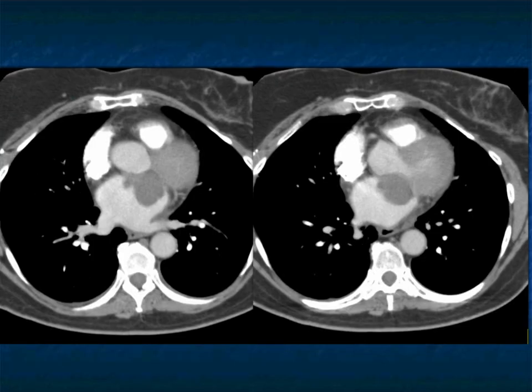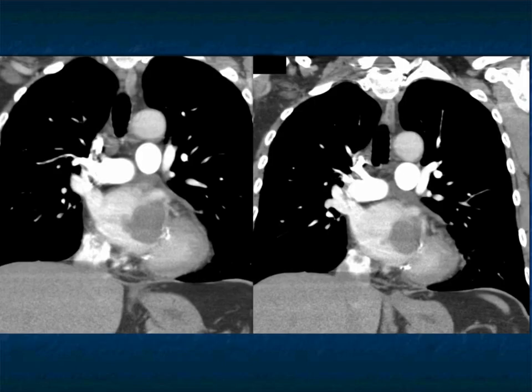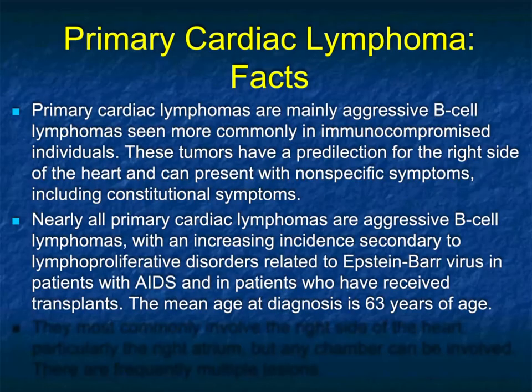Here's just a few more views of that. Just a really good look at this patient's tumor. Here it is in coronal views. So again, sarcomas of the heart are going to be unusual, but they do occur. And when you see cardiac masses, you need to be thinking about them. Again, location, right? Atrium is an angiosarcoma. Things that involve from the valves could be angiosarcs, but other things like osteogenic type tumors are considerations as well.